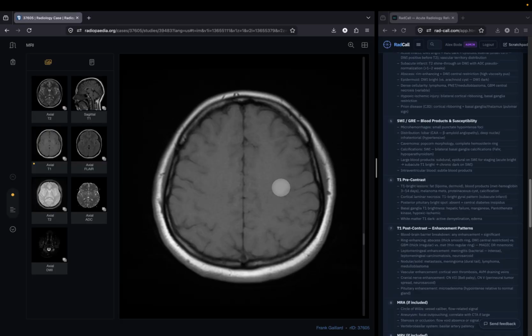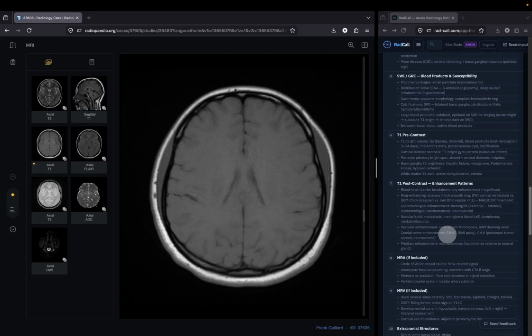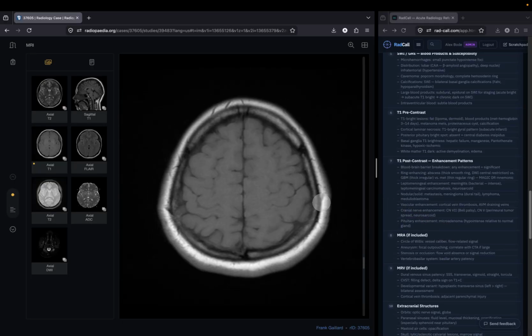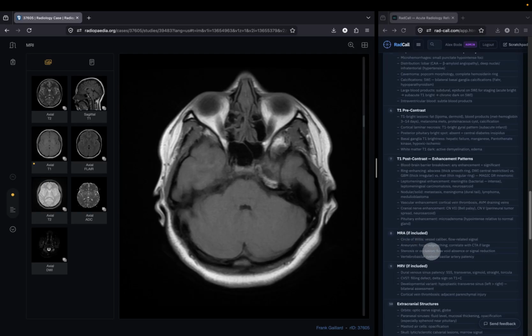And if I have a post-contrast sequence, I'll then link the two and follow them as I do that systematic approach to see if there's any abnormal enhancement anywhere. I'm looking for ring enhancing lesions, masses, leptomeningeal enhancement; subacute to acute stroke can enhance. If the patient has a history of neoplasm, particularly head and neck cancer, I'm looking at any cranial nerve enhancement, all kinds of things. Again, this is a general approach, so you tailor your search pattern depending on what you're looking for and what the indication is.